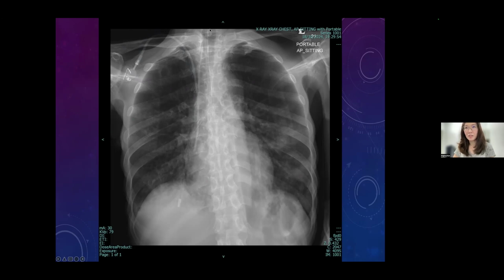So now you check the other tube, which is supposed to be the Ryle's tube, but it's coming down to the right, when it is supposed to go down here to the gastric outlet on the left side. So this is a malposition of the NG tube. So the NGT went where? To the right bronchus going down. So they intubated the NG tube, the NGT.